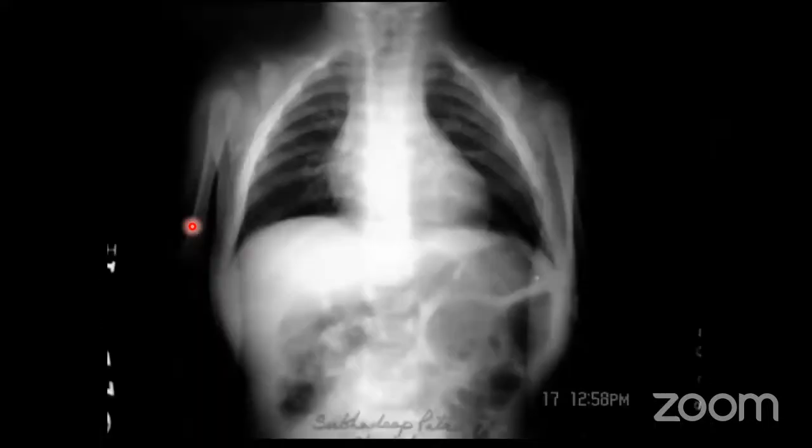So what is this? Again, you try to see, I'm giving you a hint. Try to see the bones now. Your time starts now. Any answer, Mihir? Absent clavicle, one answer. Very good. Many are getting the absent clavicle. So it is the right answer, the absent clavicle on either side.